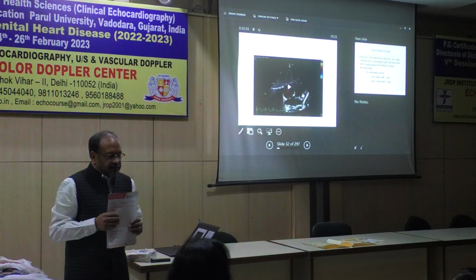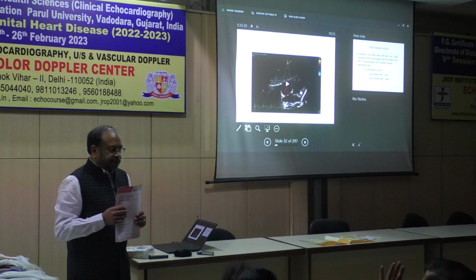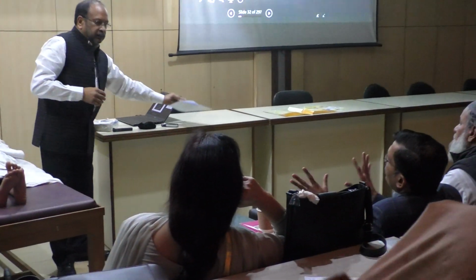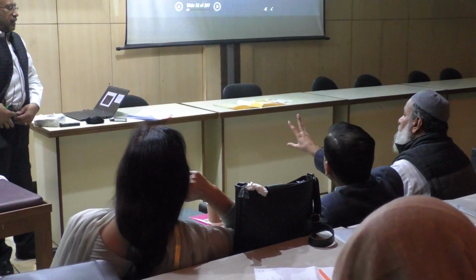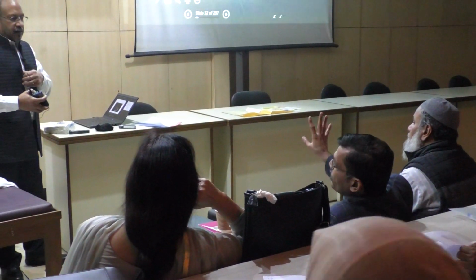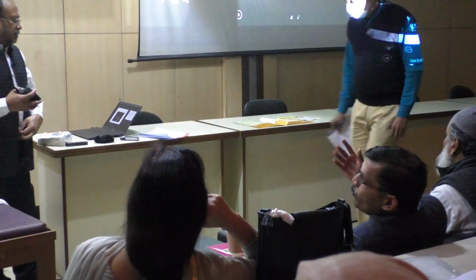Neeraj? So, what we have been seeing is if you can identify situs and looping, most of the things are sorted out from here on. Once you sort out situs solitus and looping and extracardiac position, most things will come into the picture gradually.